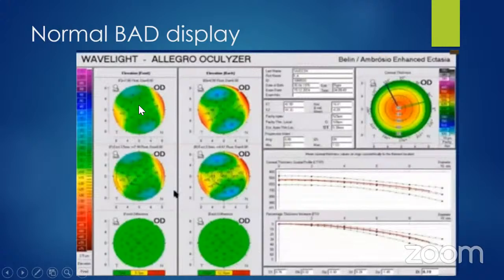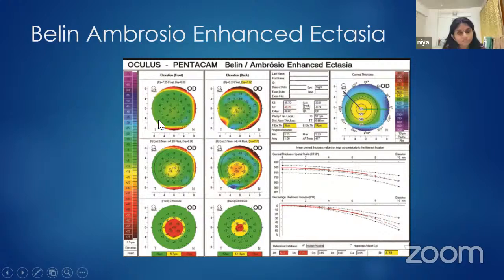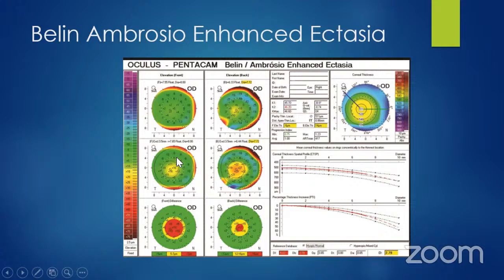So in this, if I wanted to find out whether I'm missing something, we excluded that central area and we fit a sphere. But even in that, the color scheme looks more or less normal. And this is a subtraction, that minus this, and so it is quite normal. Whereas in the next one, on the upper part it is looking normal, but when I have an enhanced best fit sphere, the ectasia is showing up slightly. Whereas if I say, okay, this minus this, then this much of values are coming.